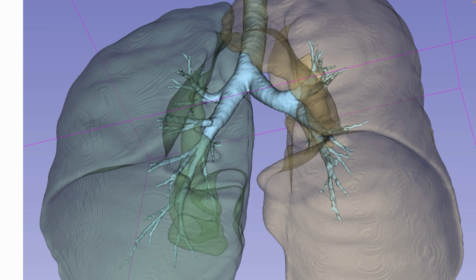And then I said, let's experiment more because there are other lung segmentation tools available, and I wanted to look at the bronchial tree better. And you can see here that there is some truncation of the medial, sorry, that's a superior segmental bronchus. You can see the rest of the four here.